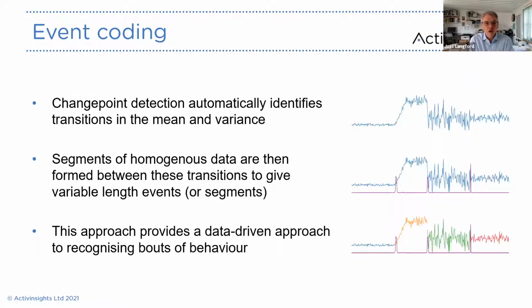I'm just going to take one little bit of a deep dive into the data, and because this will come up a couple of times, and talk about event coding. So within the GeneActiv code, and therefore within the markdowns that Charlie's going to show you, we use a process.